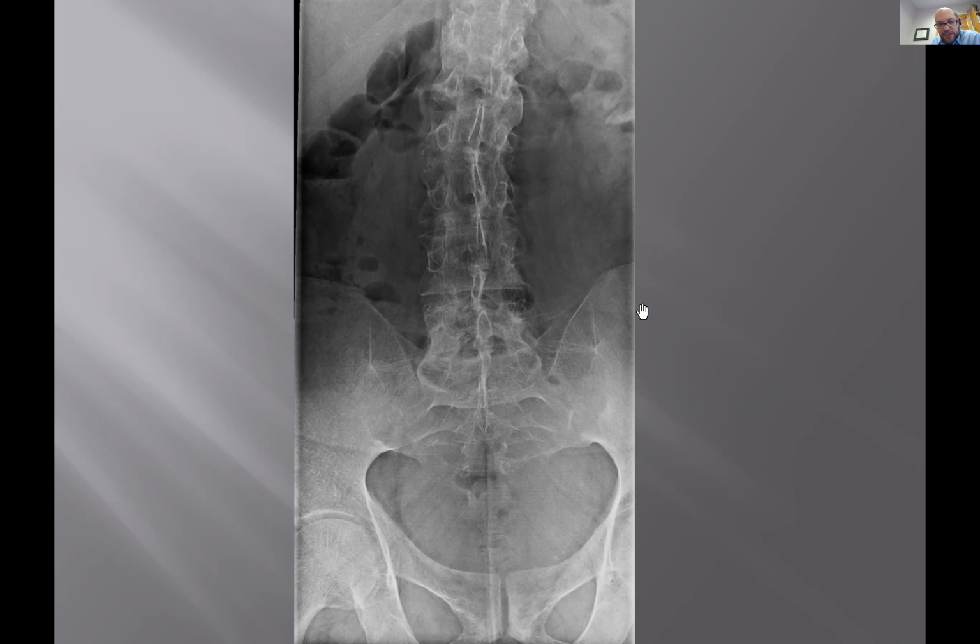Where's the, what isn't visualized on this patient? I'd call it L5. Okay, I agree that at L5 you've got some fusion here. You've got almost like the trolley track sign or the dagger sign going on here.